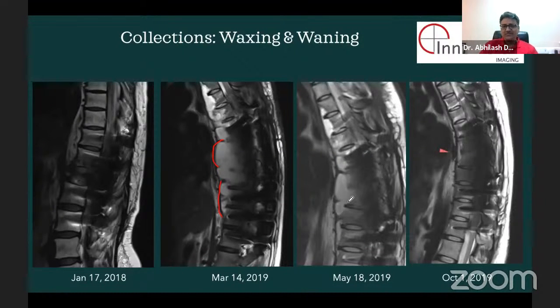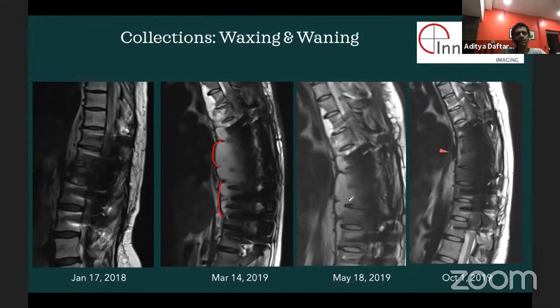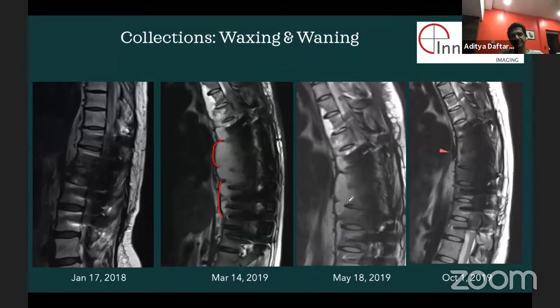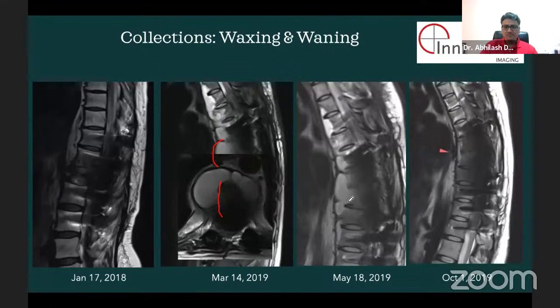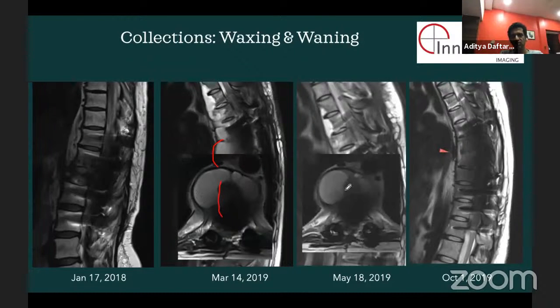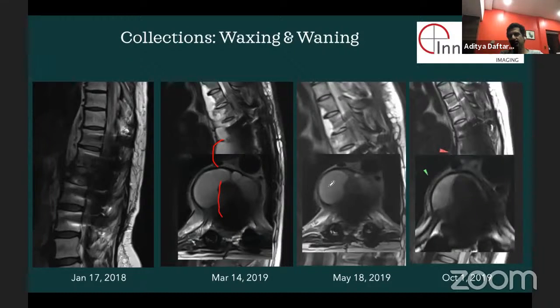What you will typically see is slender rim enhancement. If you see slender rim enhancement, we're not worried. Where we start to get concerned is when we see thick, shaggy enhancement, because then we know that's active tissue. Right. So this is just a smooth, thin-walled septate collection. This I'm not so worried about at all, in any situation.